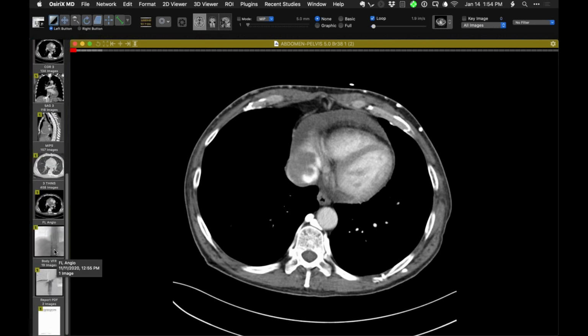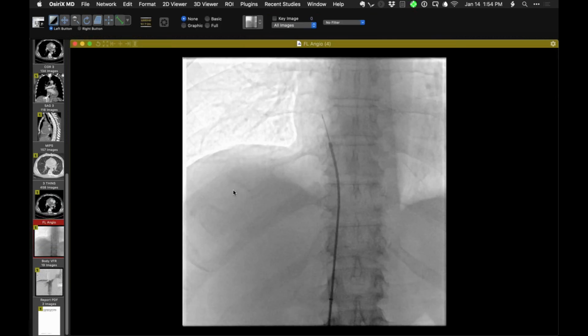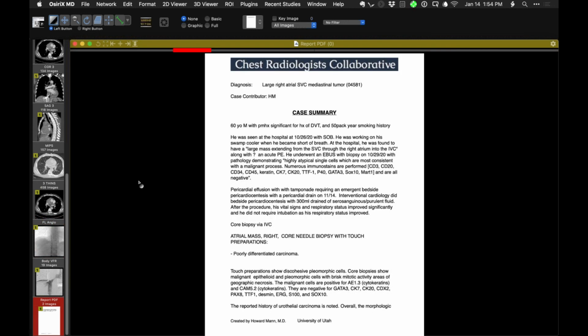And of course, you'll see exactly why the contrast medium injected in the arm didn't get there. This is coming from below, and there's a very large mass that involves the right atrium. And you can see the effects here. I think I saw this subsequently in an abdominal CT, and it shows the same findings of a very large tumor. Now they biopsied this via a vein. So here is the way they biopsied the lesion in the atrium that showed a tumor, of course.